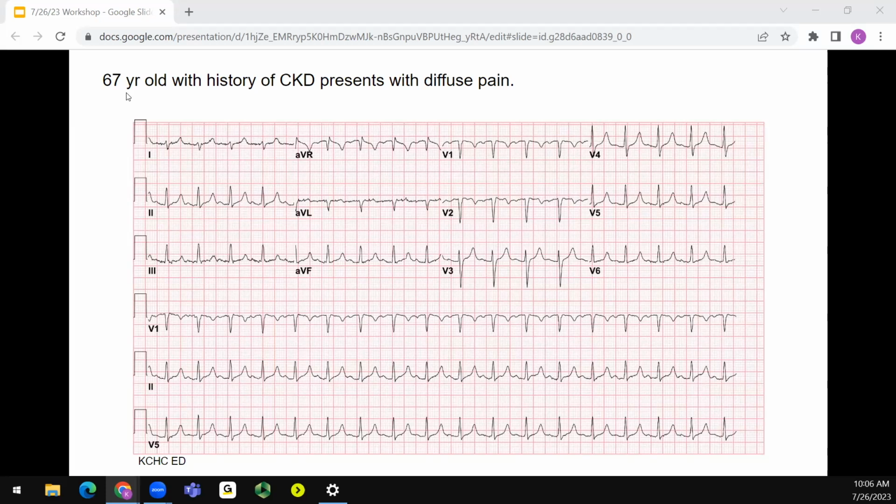Maybe, but it's only in one lead. So this patient's potassium was 7. You don't always have to have tall T waves to be peaked. These T waves look abnormal, and a T wave should be asymmetric, right? They look like pretty isosceles T waves, if you remember geometry. Typically a T wave has a slow upstroke, going up slow, and then you drop off real quick.